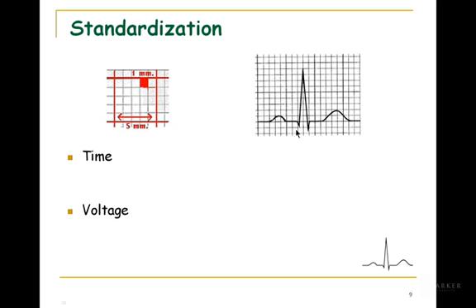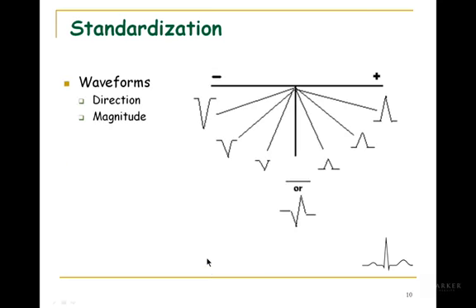Well, why is the P wave upright? Why is the Q wave downwards deflected? Why is the P wave not as high in amplitude as, say, the R wave? These are some other things that we need to be aware of. When they did the EKGs, these are rules. Okay, these are hard and fast rules. So nothing's going to change this.